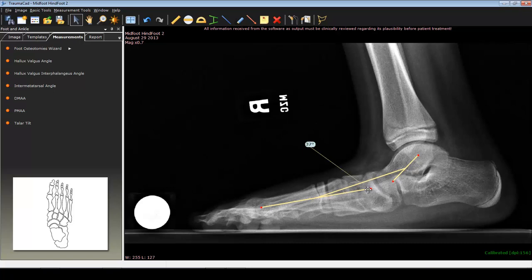When you start seeing a break, that obviously signifies a collapse of the medial column and a flat foot deformity. Conversely, if there's a dorsal apex of the Meary's angle, that's commonly seen in a cavus type foot. So in this instance, we see a 37-degree Meary's angle on the lateral view.